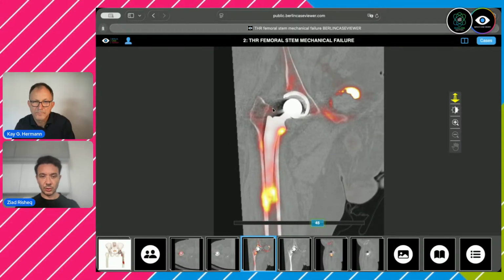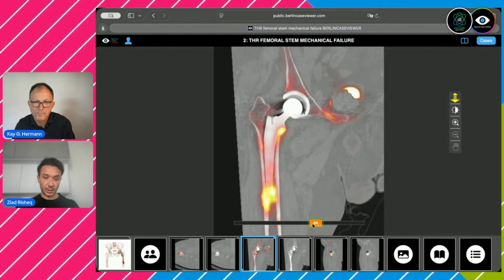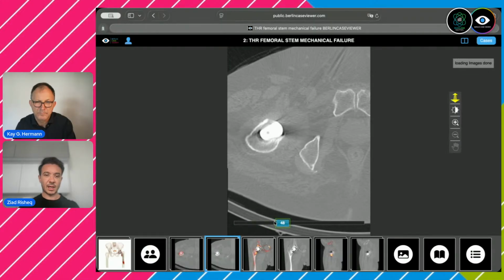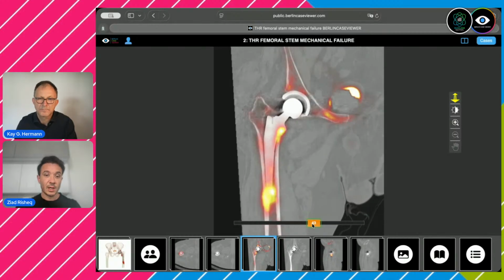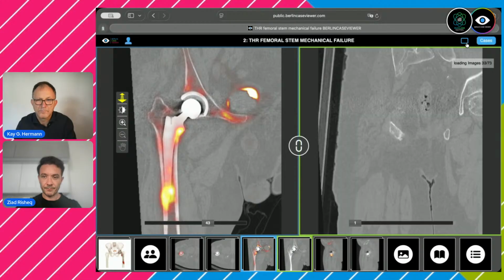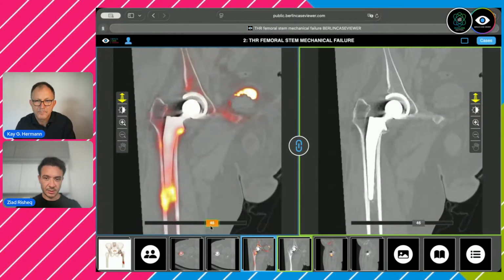What I usually do is point the axis at the femoral stem, and the long axis and the short axis I would set on the axial images at the femoral neck, and I would reconstruct the images accordingly. So what you're seeing here is multiplanar reconstructions. In this case, let's take both the fused and CT images.